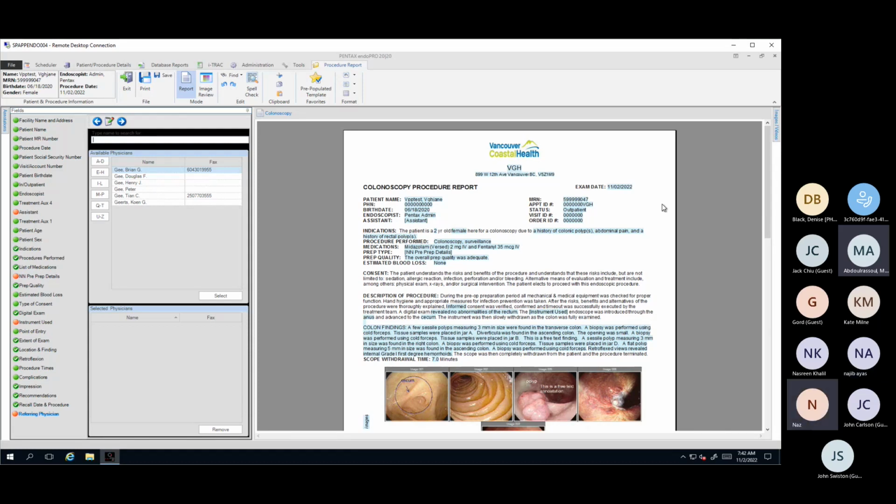One of the things we could do, and this is one of those additions we can do down the road, is I can add another field over here called consent comments, with a free text option where you can state stuff. So I could add another field called consent comments, and if there's anything you want to comment on in regard to consent, you can go ahead and do that.